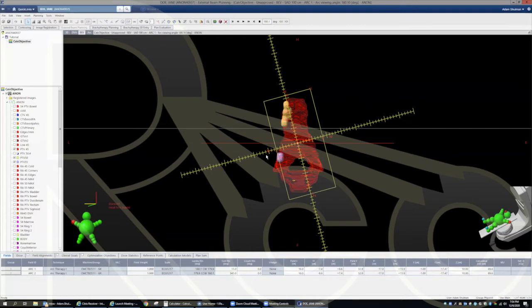And so you can practice and see how that changes if you have, say, a 20 cm jaw or a 16 cm jaw, and hopefully you'll see a reduction of those big open beamlets. So in this case, I relaxed it to 16, and then what I would do is play it and see if it looks good.